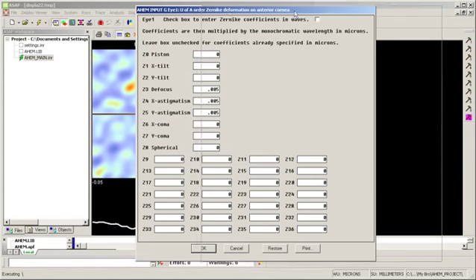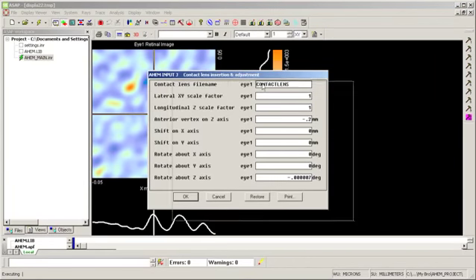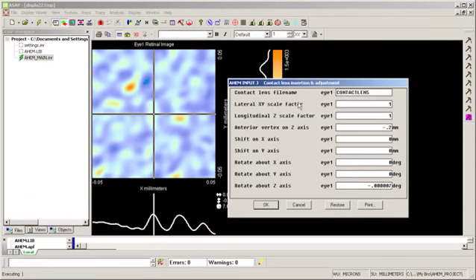And this was the aberration on the cornea that created this retinal image here, this aberrated eye. I've got basically no point spread function on this eye. So I click OK, and now I get prompted for a contact lens file name. So you can create a contact lens in some other CAD application or create it within ASAP. So I created a contact lens within ASAP.